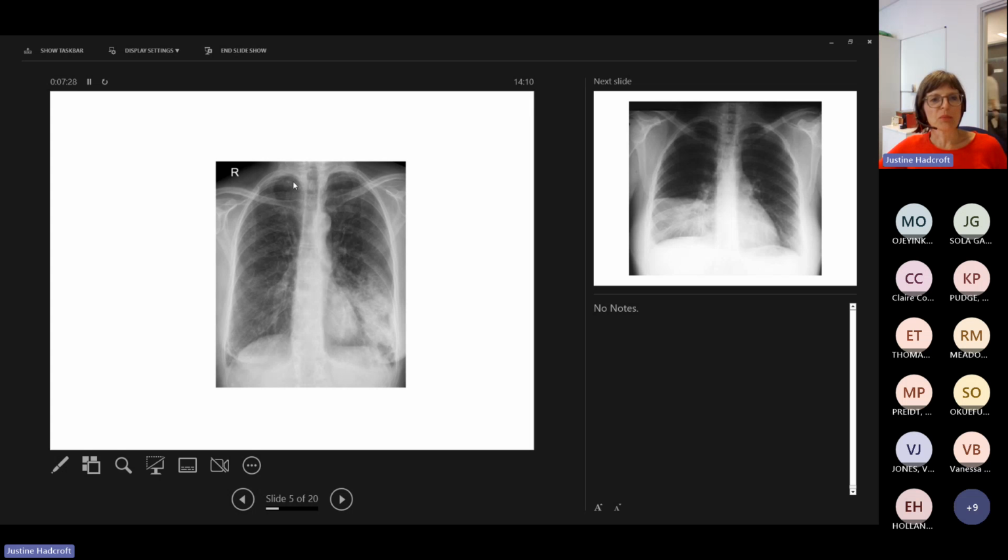So this right lung is probably normal. It's quite hyperinflated again. So, plenty of ribs, 1, 2, 3, 4, 5, 6, 7. Nice sharp angle down here at the right side. You see the breast shadow here, the diaphragm there. You can see the trachea, the right main bronchus, left main bronchus, and the vertebral column. So that looks okay. If you look on this side, the difference between the left and the right is you can see the left heart border, but that's normal.